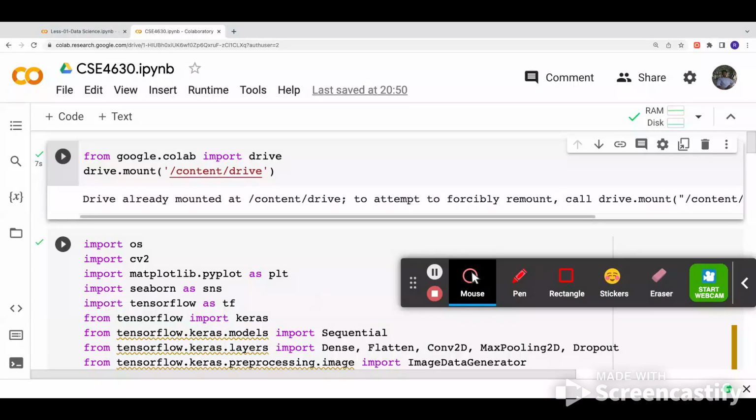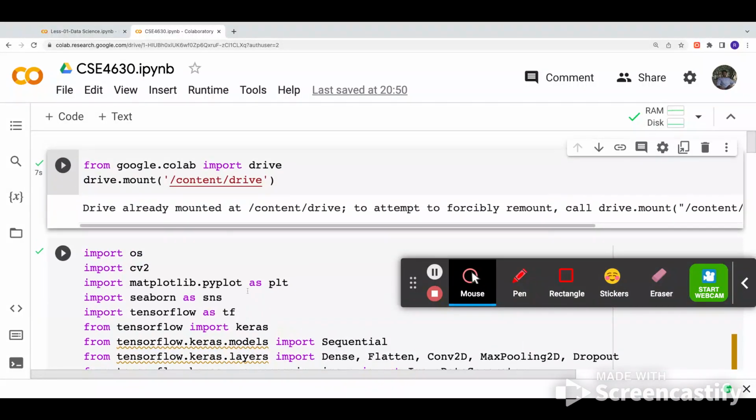In this lesson, you can learn the basic application of medical imaging classification using deep learning methods. Here I show a hands-on process to classify medical images using deep learning in Google Colab. So, in medical imaging for image classification, we need several steps to complete the classification process, and in this work we will show the complete process to classify an image.